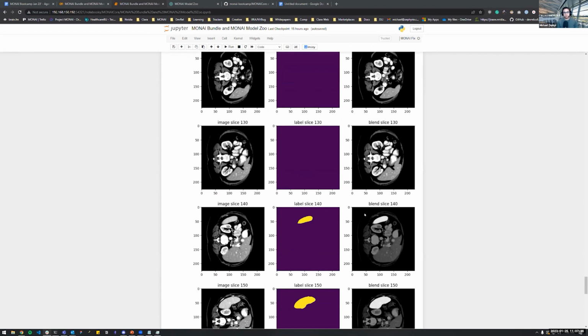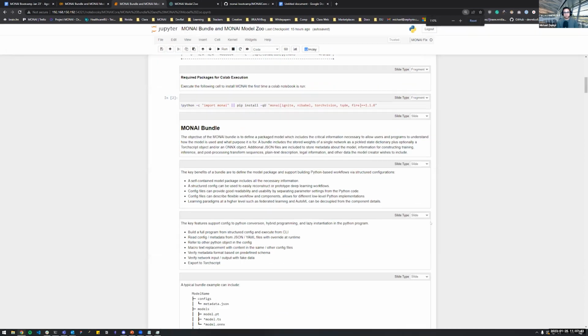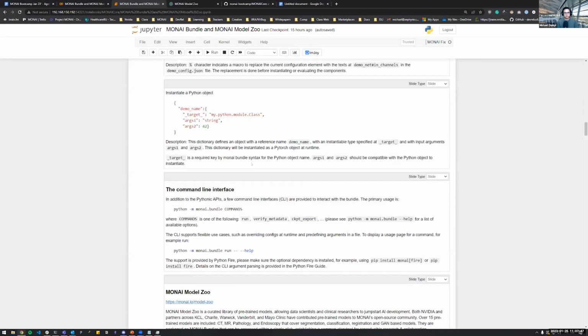Yes, generally yes. And so really quickly, let me open up. I mentioned before that you could call out to any custom function that you want. So if you'll see an example like this one here, if you were to write your own custom network, you can just call it out the same way we would call it here. So you instantiate my custom network. The target is my custom network class, with whatever parameters you might want, just like Ben showed in the first notebook of this, how we might create a wrapper class around it.